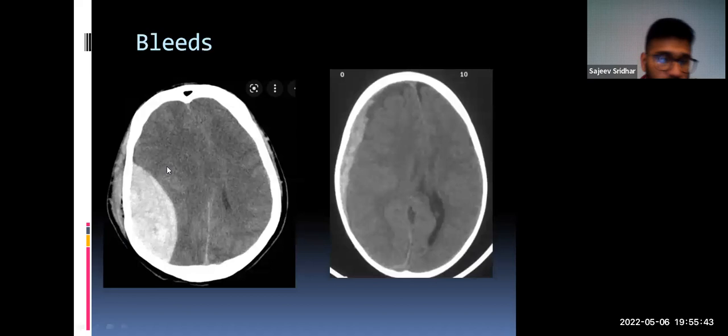You have to pay attention to it. The reason an epidural hematoma has this shape is because it involves a rupture of an artery. Arteries are high pressure. High pressure means the blood just gushes out very, very quickly into the epidural space. The main features of this one are that it is very, very convex in appearance. And usually it's a result of some kind of trauma.